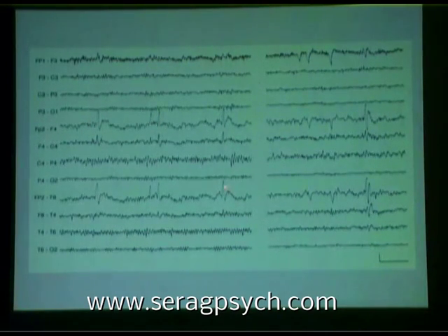And you can see they're spread here. And they don't involve the temporal lobe at all, really. I mean, there's a little spread maybe to F8, but that's also a frontal electrode. So these are right frontal polar spikes. The curious thing about them is that usually frontal polar spikes are seen much better over at the contralateral FP1. In this case, you don't see it very much. You see it just a little bit. Usually it's quite more.